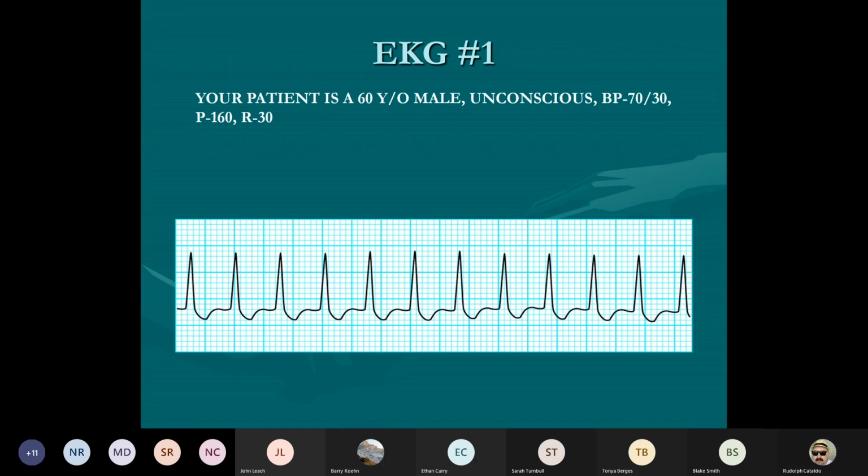And why? I'm not sure. It's regular. Okay, let's talk through it. It's regular. Do you see a P wave? Barely. I mean, it's hard to tell what's a T and what's a P. Okay, so you just told yourself what the rhythm is. If I can't tell what that is, and my rate is 160, if I put it that way, what would you call this rhythm?